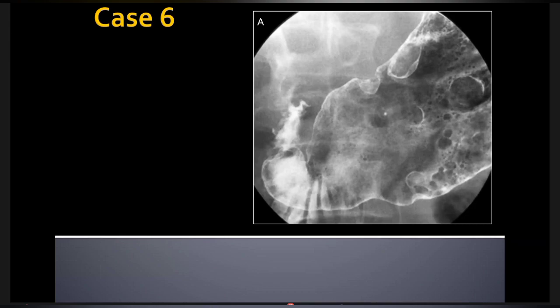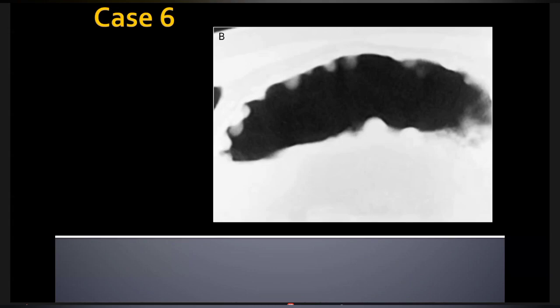Okay, fine. Right. And similarly here as well. So you've got these filling defects, which are areas of elevation of the mucosa, yeah? And you're getting these little circles of barium around them, which is giving you this kind of circular filling defect appearance, okay? Yes. If I show you the next image, this is a CT image that's been put on lung windows.